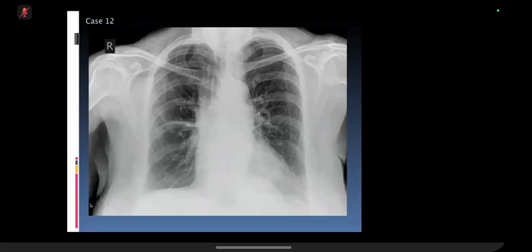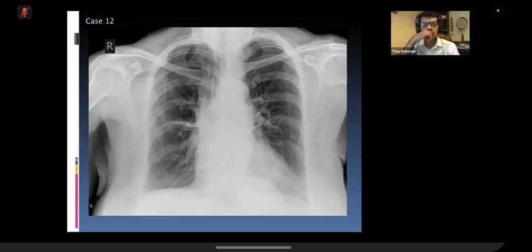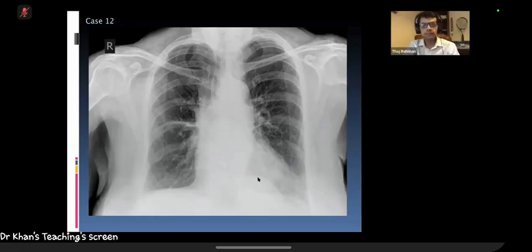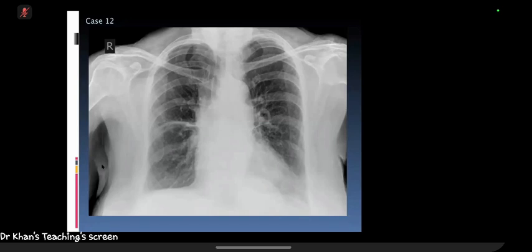Looking below the diaphragm and in my review areas as well, there is a slight hump in the left side. It's asymmetrical compared to the right in the diaphragm, along the diaphragmatic line. There's an increased density, which is fairly well circumscribed, and I can see the left hemidiaphragm going across it.